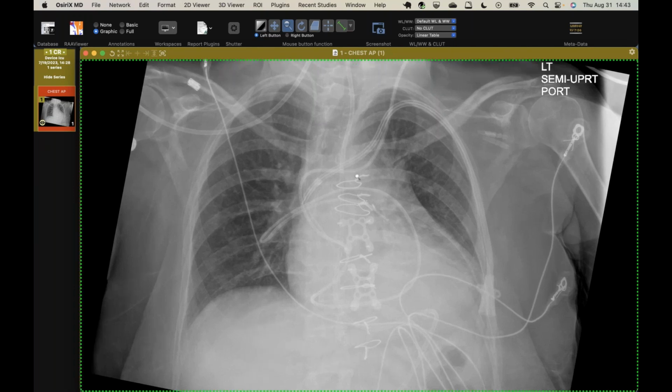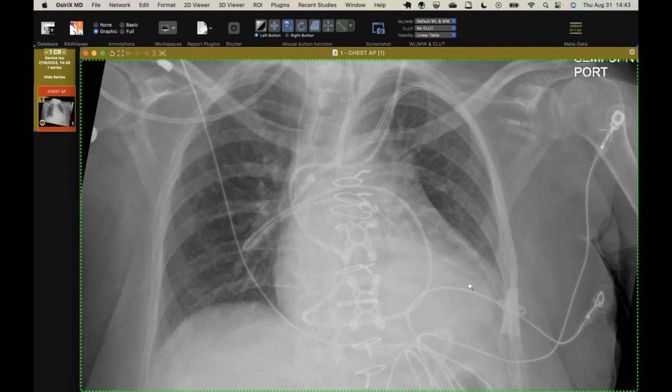So this was just kind of an odd case. It's a good case for trainees. We're always looking at positioning of catheters, but I don't recall ever seeing this one and how they managed to do this. This patient has a pulmonary artery catheter that takes this very odd route here. But then it comes out through the RV outflow tract, right pulmonary artery, goes into the interlobar, and then somehow loops back on itself and comes all the way back towards the main pulmonary artery.